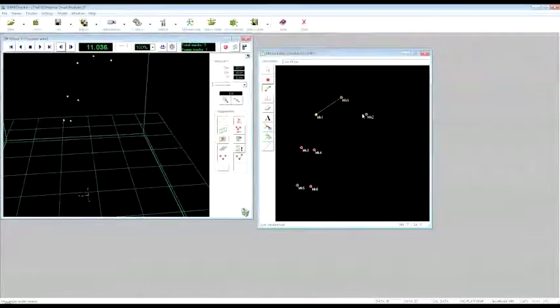So marker 1, for example: I want to link marker 1 with 2, the 2 with 0, and then the first with the third, the first with the fourth, and the fourth with the third, and so on.